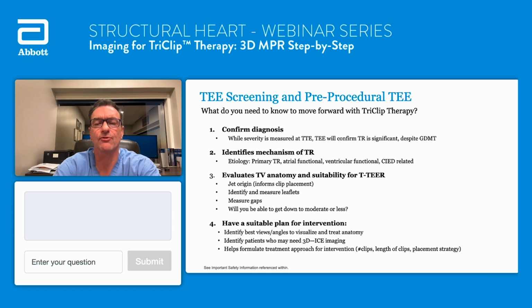And we've talked about this before, but this includes primary TR, which is roughly 10% or so of all cases, atrial functional TR, ventricular functional TR, or CIED, implantable cardiac electrical device related TR. We want to evaluate the tricuspid valve anatomy and the suitability for T-TEER. We have to look at where the jet origin is and understand what scallops are involved, identify and measure the leaflet lengths. Importantly, and we'll demonstrate today, measuring the gap and identifying how that impacts patient selection.